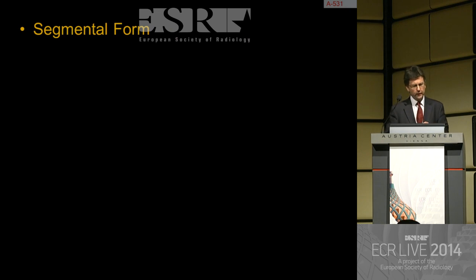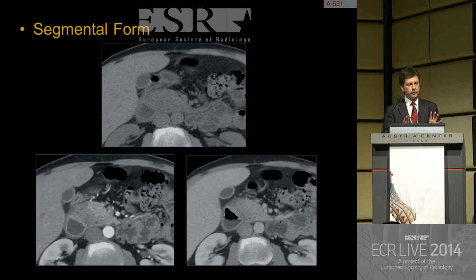If we move on to the segmental form, this is slightly different. It's still a sheet-like infiltration, but not only do we involve the duodeno-pancreatic groove, but it also infiltrates into the pancreatic head itself.